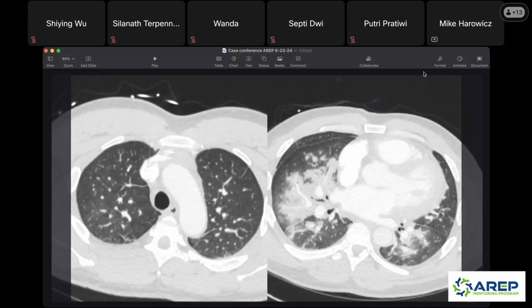All right, so what am I seeing? And if anybody has a diagnosis so far, feel free to interrupt me, shout it out. It'll always be welcome. I'm seeing some interlobular septa that are a little thick, right? Not a ton of them, but here and there, there's some thickening. We get lower down that these are very central opacities, right? Sort of sparing the periphery. So it looks similar to our case that we had earlier of some pulmonary edema. So let's presume this is pulmonary edema.